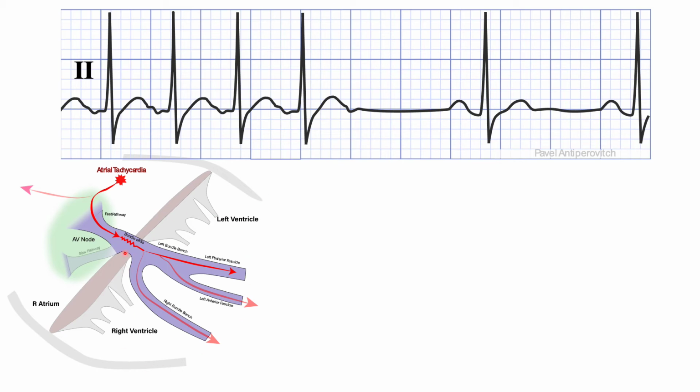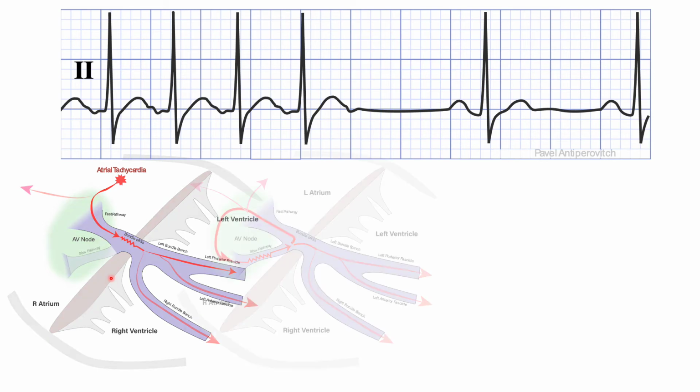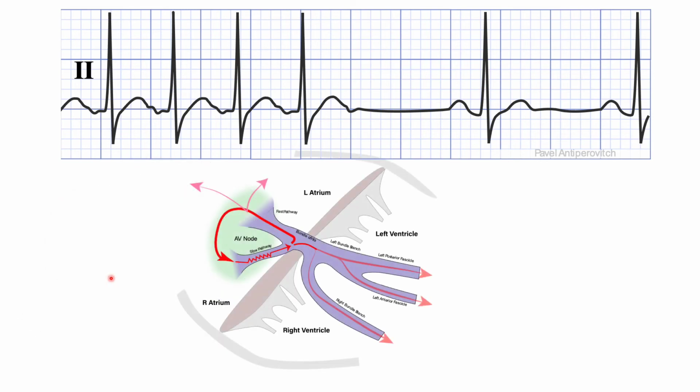To use atrial tachycardia to explain this observation, 2 isolated events would have to happen at the same time, at the same cycle. So the atrial tachycardia would terminate in its mechanism, and the last atrial activation would block in the AV node. It would be quite a coincidence for the 2 to happen at the same time, hence atrial tachycardia is very unlikely. Now let's look at AVNRT.